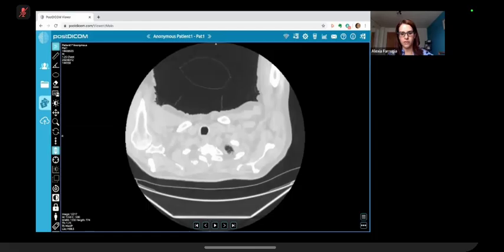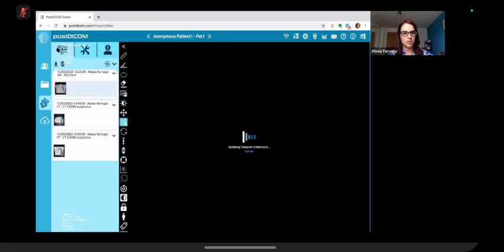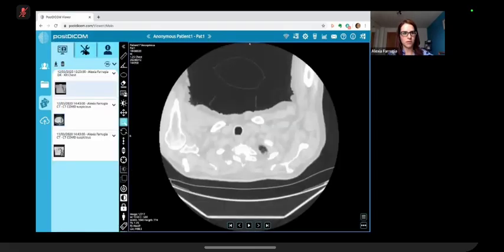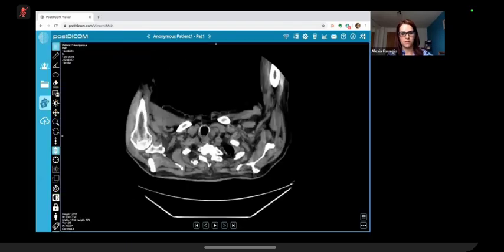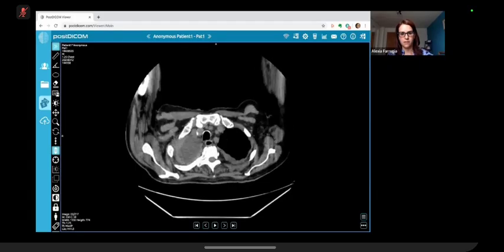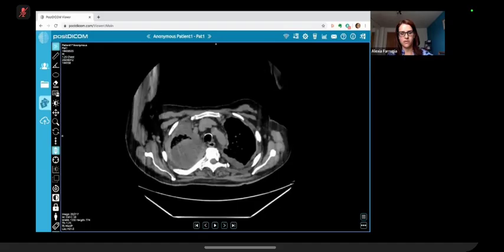I will go through it on the soft tissue window now. So, focus on the lungs.